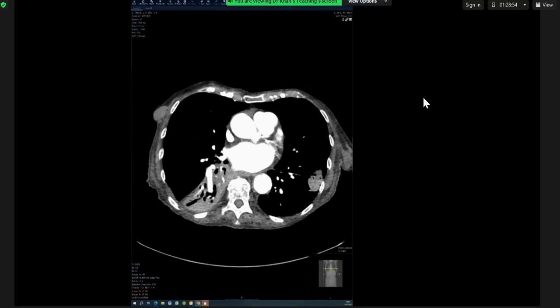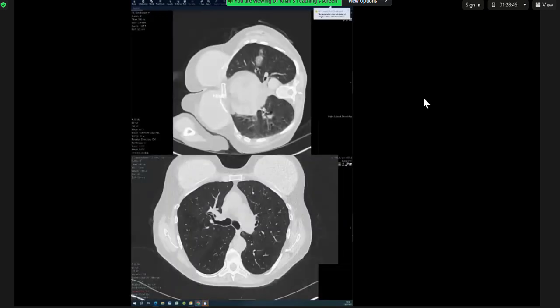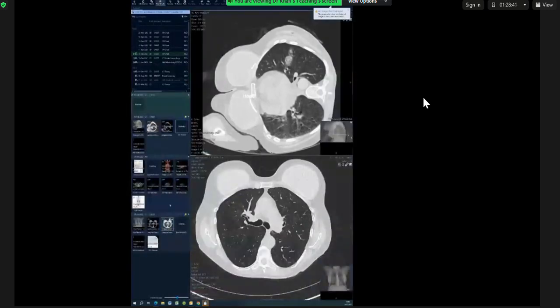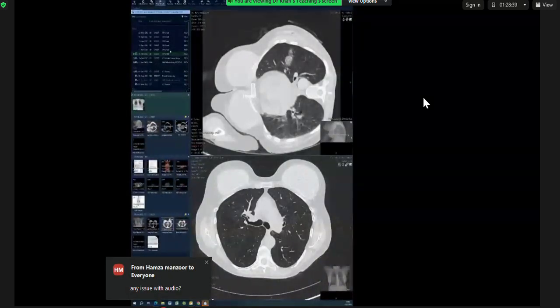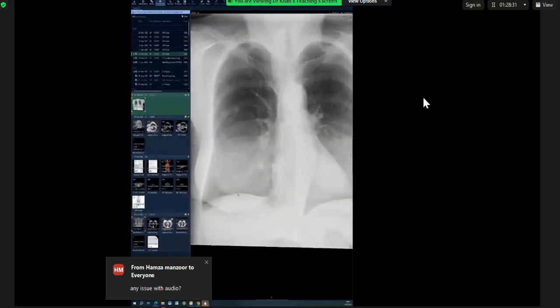I'll take you to the second one we did, which was the small nodule. I think you did really well here. You picked the nodule straight away, which isn't always easy. So that was a good pick. Again, the breast implants, a very common mistake, but in this one, at least you can clearly see the outline of the breast implants. This was a nodule.